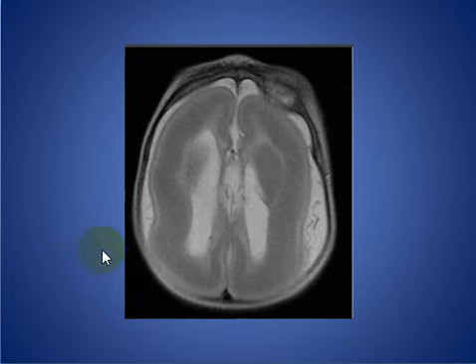Here, this is another patient with developmental delay and seizures. It is a 4-month-old child. As we see here, there is a classic example of lissencephaly with possible agenesis of corpus callosum. And here we see a very thick cortex.